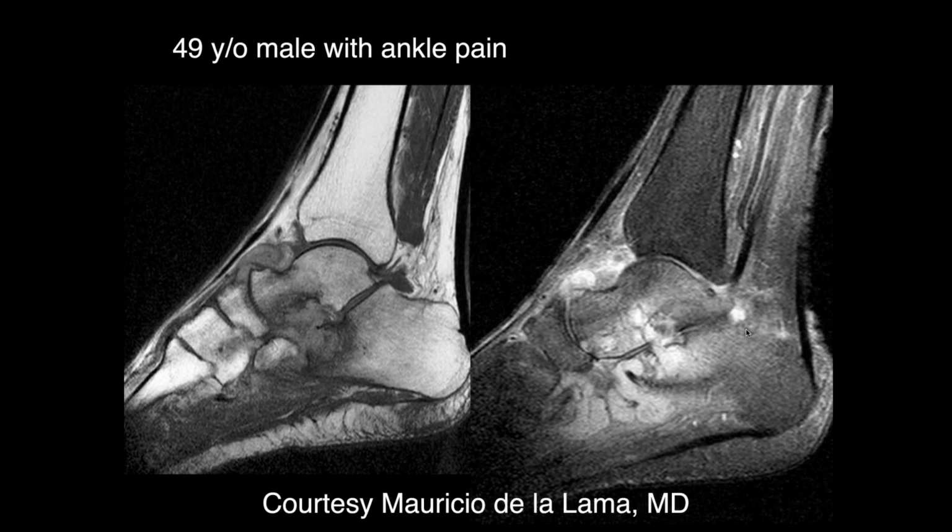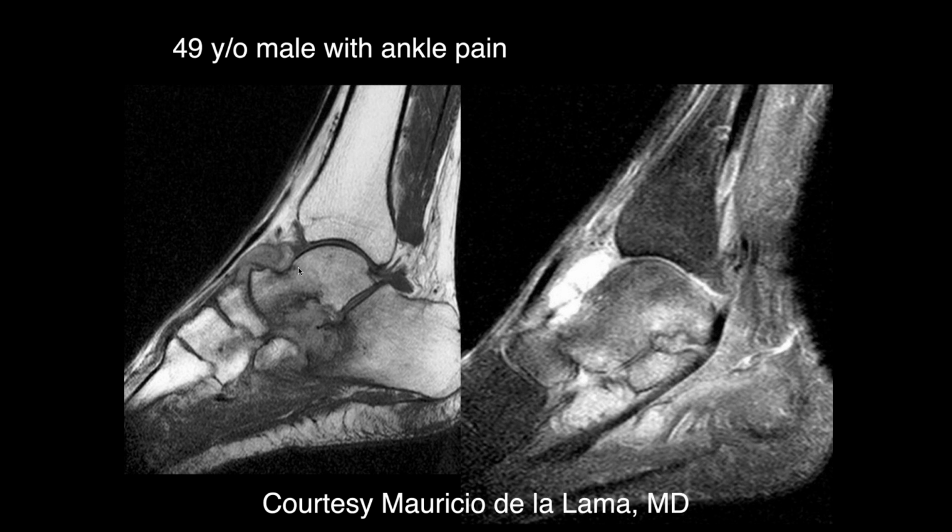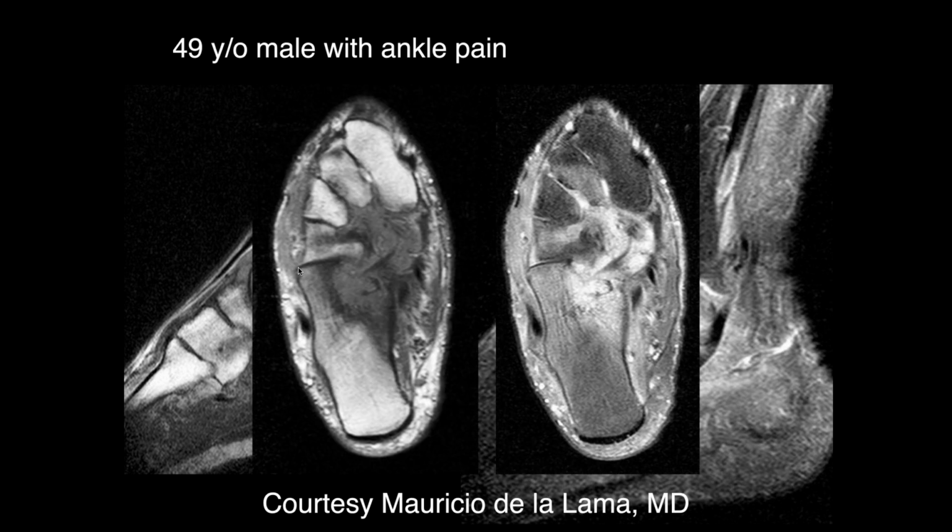Okay. Jennifer. Okay. So here we can see osseous erosions along the subtalar joint, and also in the anterior process of the calcaneus, there's large osseous erosions and a subtalar joint effusion, and also a talonavicular joint effusion. This most likely is an infectious osteomyelitis. It could be atypical as well.